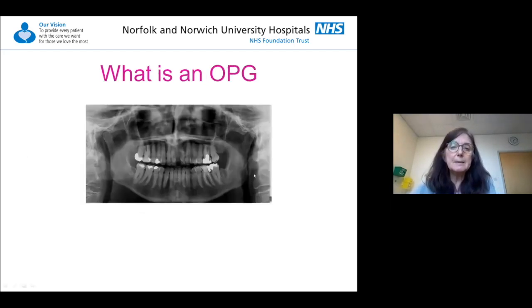So this is a standard issue OPT radiograph. And as you can see, lovely views, teeth, fillings, an extraction socket, the mandible. If you look really carefully at it though, you'll see that bits of it are in much sharper focus than others. And if you look at the roots of the lower incisors, you could be forgiven for thinking there might be pathology there, when what we're actually seeing is it just being out of the focal trough.